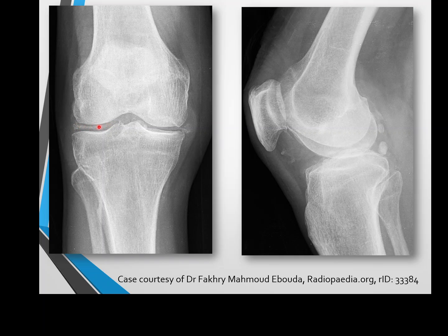It's a linear appearance of roughened and very thick edge, quite shaggy with ill-defined borders. So this is most likely going to be within the meniscus. You've also got some loose bodies back here, quite large joint mice, and you can see it posteriorly and leading anteriorly just here as well.